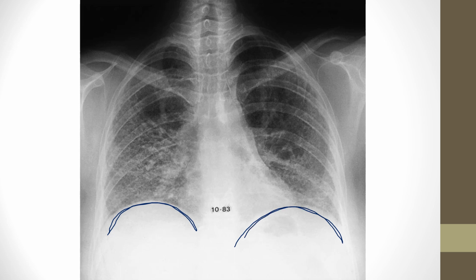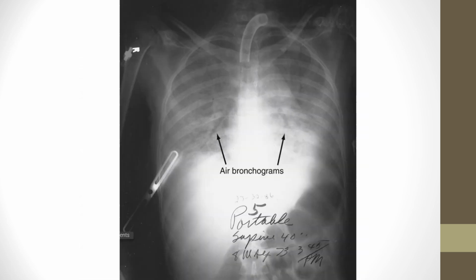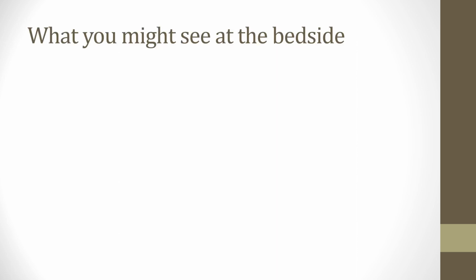because lung volumes are smaller, right? Count the ribs. How many ribs do you see? All right, so that's the classic ground glass look. All right, air bronchograms, they highlighted them here for you. And this patient obviously has a tracheostomy tube up here. You can see how they highlighted the air bronchograms over here. Hopefully you can see them in there. That confirms an intrapulmonary process, right? So this is what's known as an alveolar filling process that goes along with this.